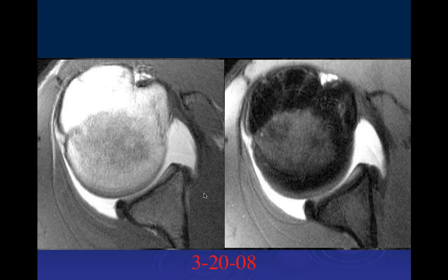Yeah, so it seems like things have actually reattached or scarred down, but it's sort of anterior and around on the other side there. So here is actually the anterior labrum, and this is scarred down here. We have a blunt anterior labrum there. The patient is still unstable. And this patient, after this MR scan, went for surgery.